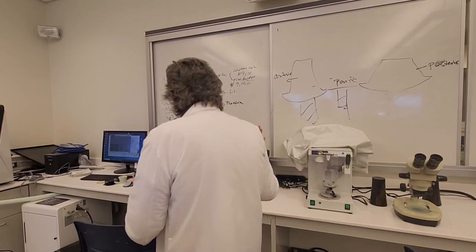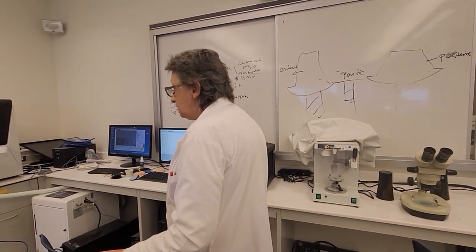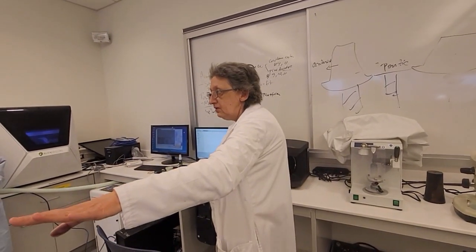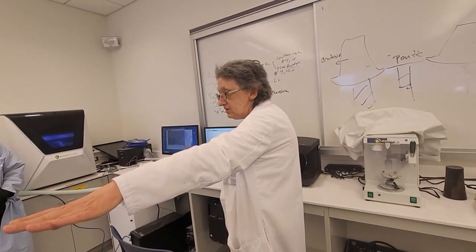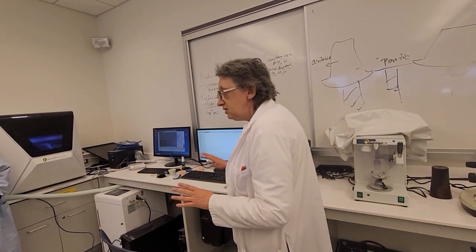So without further ado, I'm going to show you how to set up the order, and I already did an order for you on the computer, so you can start working on that one when you have time. Now, a little bit of briefing about the CAD/CAM.